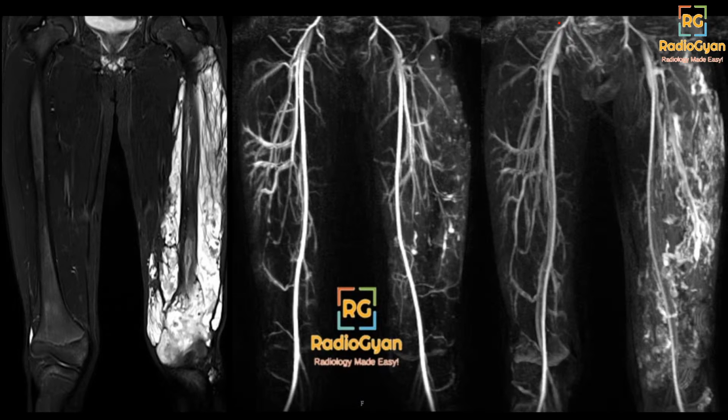So moving on to this case, let's see. Okay, we've got a couple of good answers. So what we see here is a septated, kind of ill-defined lesion almost involving the entire left thigh. It's hyperintense on fat-saturated images, and you see these small septa. We don't see any obvious phleboliths, although this is not a very good sequence to look for them.